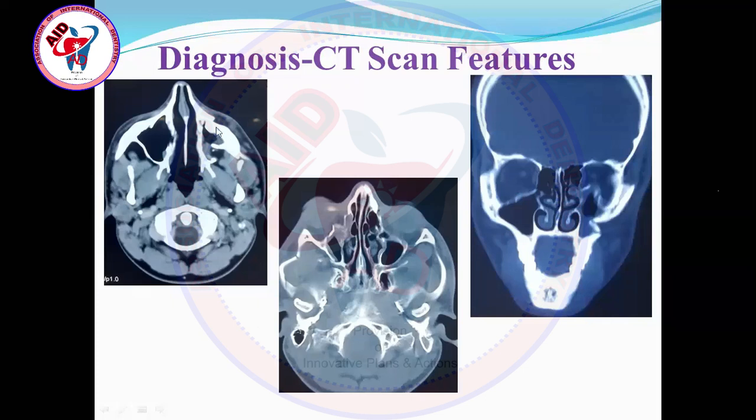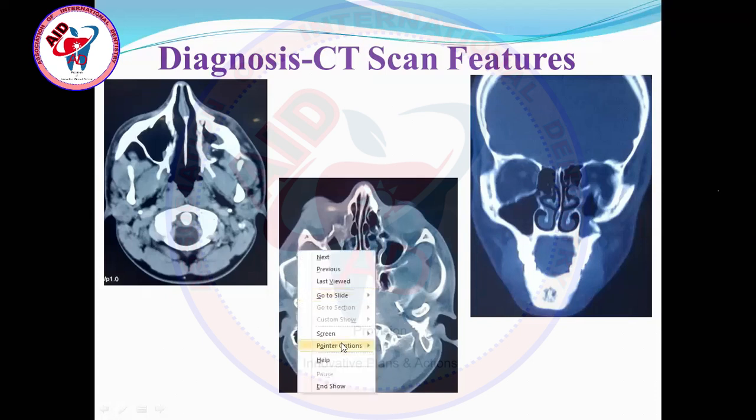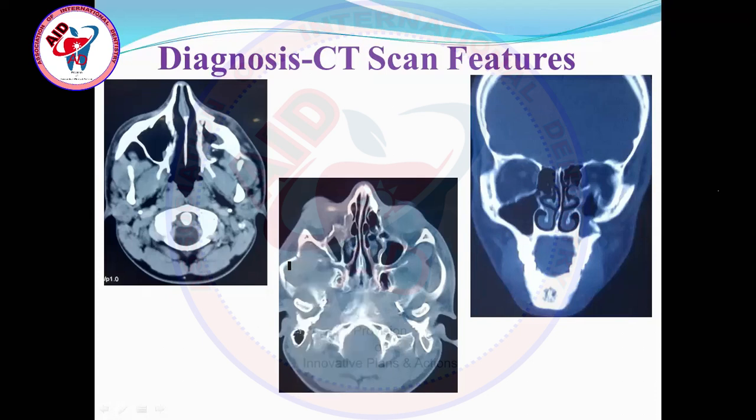And the body of zygoma has been displaced towards the sinus, clearly visible on the axial view. Like here there is a step deformity, and in this axial view there is damage to the zygomatic arch, a typical V-type infraction, again here in the mid picture on the right side where I am moving this cursor. Look here, V-type infraction.